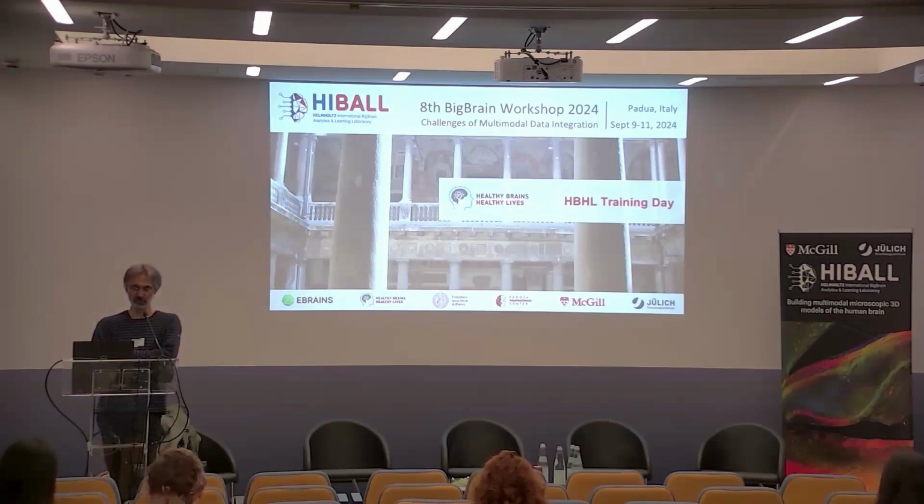And so this is why our research program now goes to trying to make some unsupervised learning to try to detect, I would say clusters, to say it fast, but it's not clusters. It's patterns that can be found in subpopulations, but not necessarily in every subject. This is what we are working on the research side now, but this is not available in BrainVisa yet.